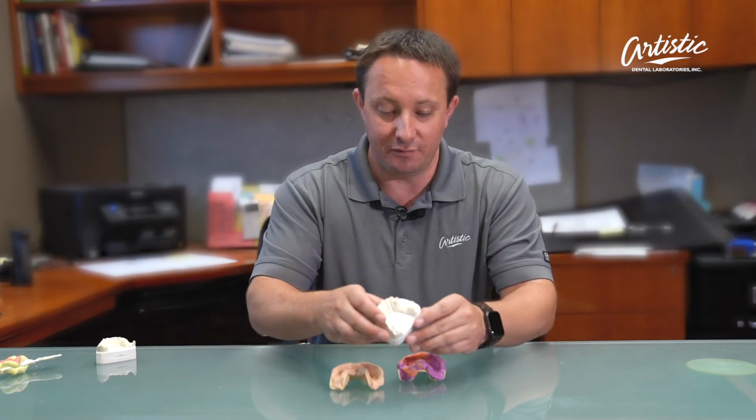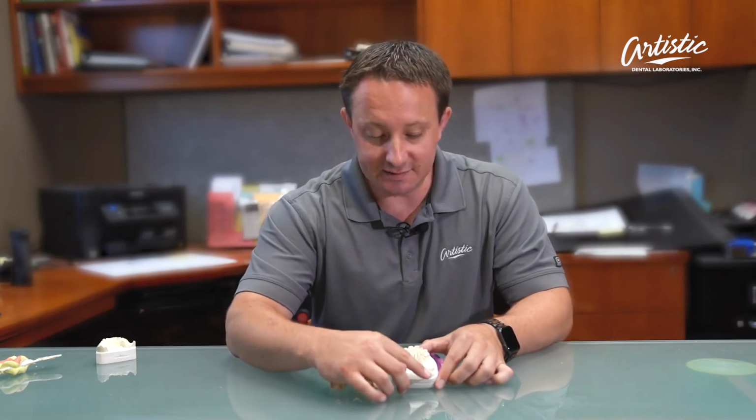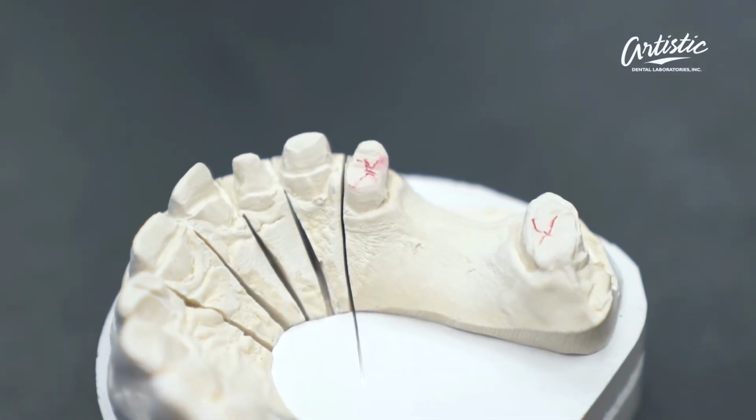Likely what will happen is if we do not get a new impression, we're going to have an ill-fitting crown or a rocking bridge or something of the sort there. When we take our models and we are finished pouring our model, you can see where the distortion is. This is not going to be acceptable for a crown and bridge restoration. We will need a new impression for this, or there will be some heavy adjustments chairside in order to get this fit, and may even need some composite to fill an open margin or something along the sorts. Either way, it's going to be a compromised restoration and not the best thing for your patient.